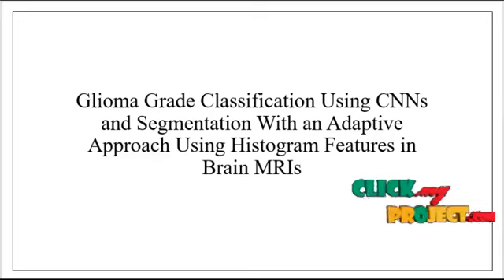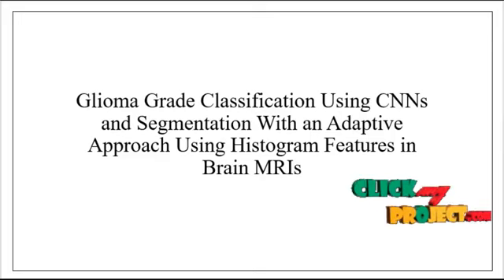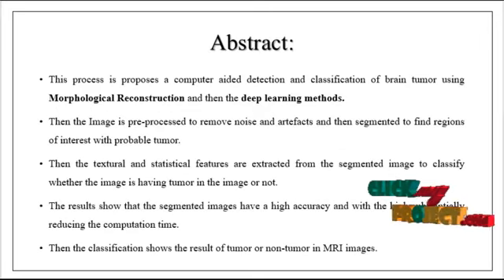Now we are going to discuss the project Glioma grade classification using CNN and segmentation with an adaptive approach using histogram features in brain MRIs. Now we are going to discuss the abstract of the process.